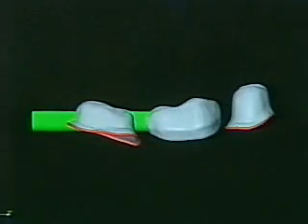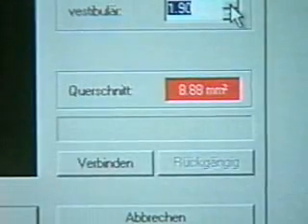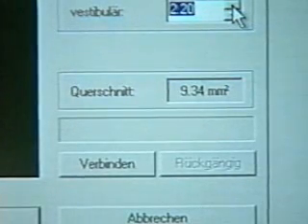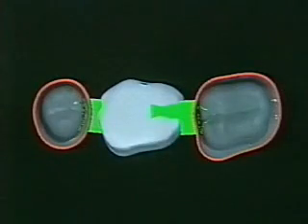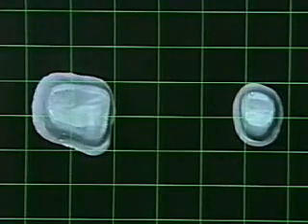The joints of the pontic to the crowns are likewise already prepared. The right position and cross-section are established with keyboard and mouse, in this case 9 square millimeters, using the software. The program reports every time the calculated ideal size falls short. The computer also supports optimal alignment of the bridge to the cutting axes.